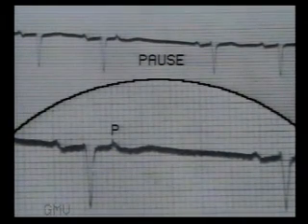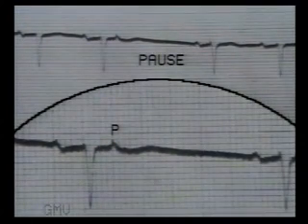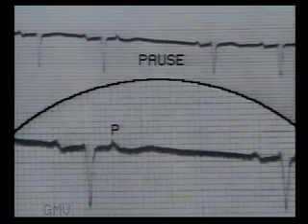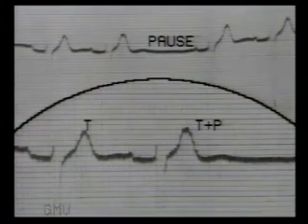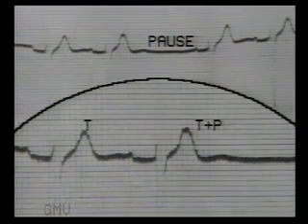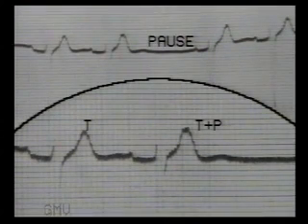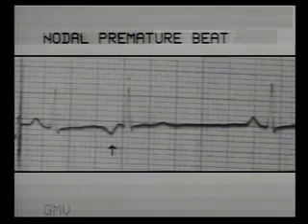It looks exactly like a sinus pause, but the last T wave shows a dent or alteration. This also means that to diagnose a sinus pause, the previous T wave contour should be normal. In this tracing, note the change in the shape of the T wave due to the P wave of the non-conducted atrial premature beat. Only close observation will tell that this is not a sinus pause.